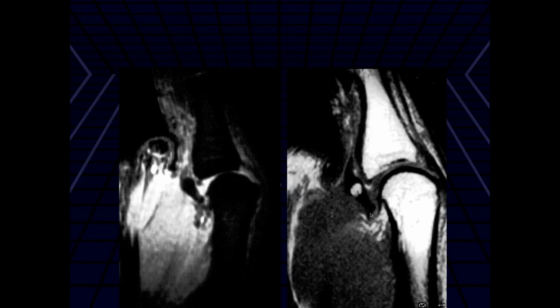So it's not uncommon to get ossicles in the volar plate. I don't know if that's congenital, maybe, or sometimes it may be post-traumatic, like we've seen in other thickened tendons here. In this particular case, we have a tear of the origin here, the proximal aspect of the volar capsule and its attachment to the metacarpal here. Typically occurred in hyperextension type injuries.